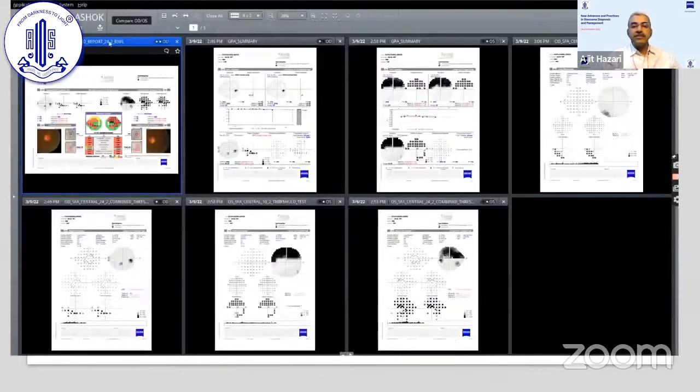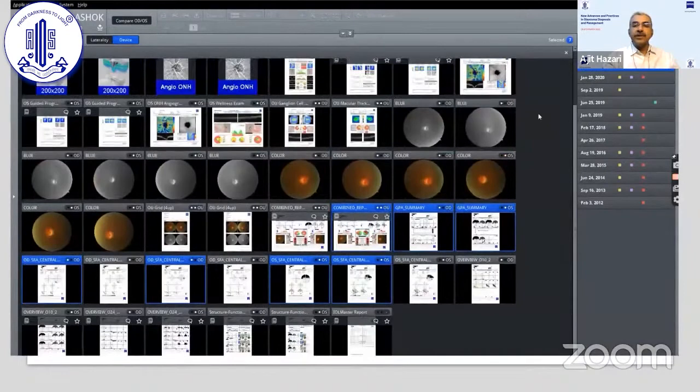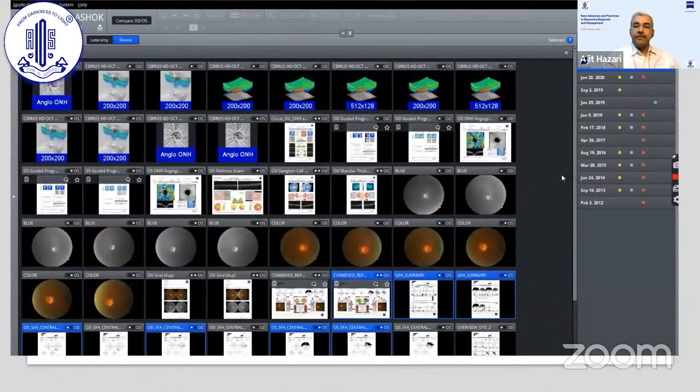And as Dr. Ronnie said, with the Glaucoma Workplace, you can integrate the 24-2C and the previous 24-2 seamlessly. So there's no loss of data, and we can easily look at all the data within no time.